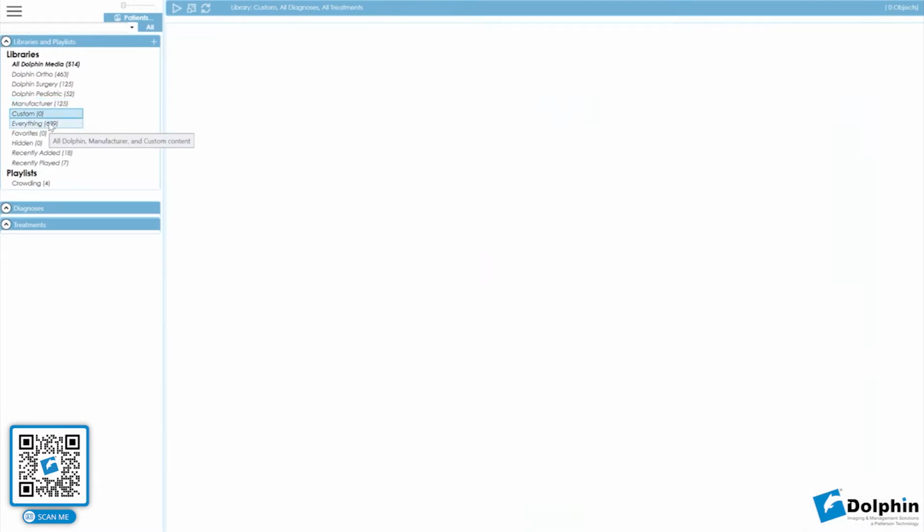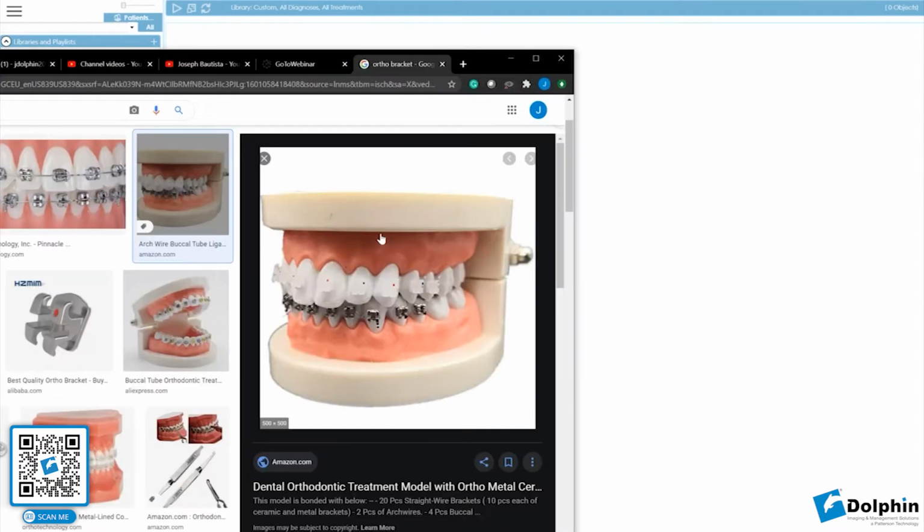Custom allows our users to add their own content to Aquarium. So that's another nice thing about our Aquarium software: here we can add our own custom videos. For example, I can bring up a web browser and maybe there's an image that's not available in Aquarium.